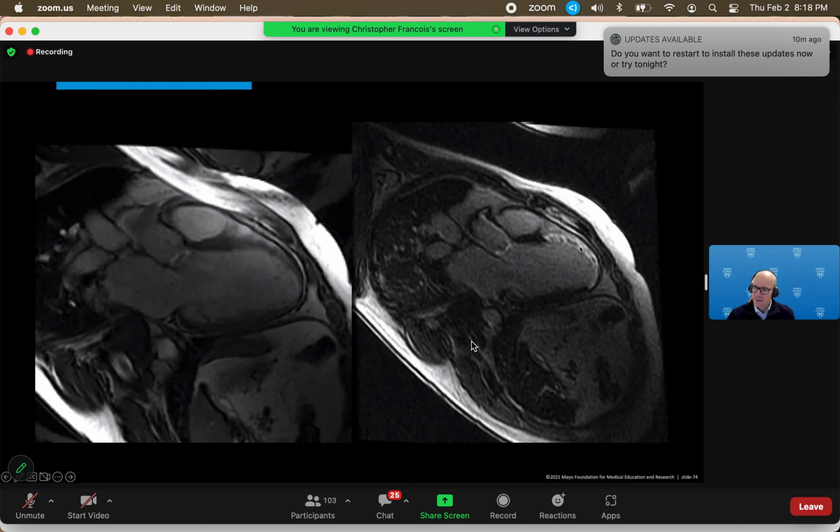This dark area that you see surrounded by the white enhancement, that is microvascular obstruction. That indicates that this is a very, very severe myocardial infarction. This patient has a very, very poor prognosis for recovery, even if they go in and open up his occluded LAD. On the cine images, you can also see there's a small jet here from the mitral valve that is mitral regurgitation.